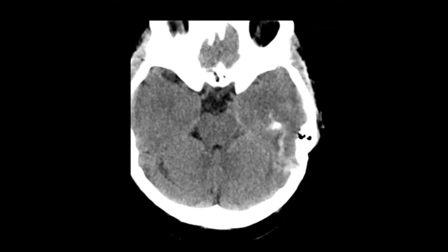So this is the one that I was talking about. This is how the normal area looks. You can see maybe part of the transverse sinus and then the sigmoid sinus, but definitely here there is an asymmetrical hyperdensity, so I know it's not something like polycythemia. And next to it definitely gives it away.